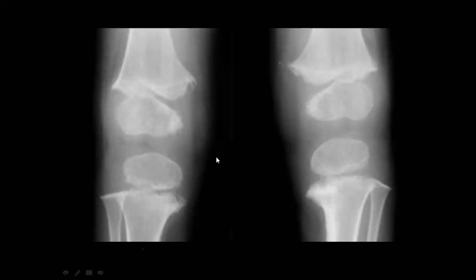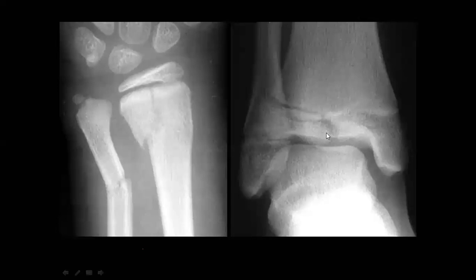But I mean, if you want to put all the differentials, starting because it's pediatric, it starts with all the congenital ones, like you mentioned. And there is something called metaphyseal dysplasia. Just put it in your differential, just to know the approach, okay? But don't forget non-accidental injury when you go through your approach, okay?